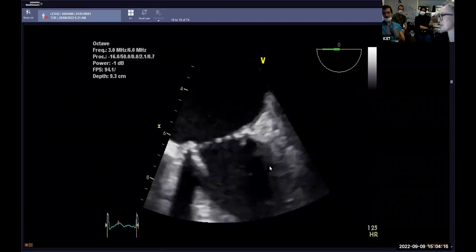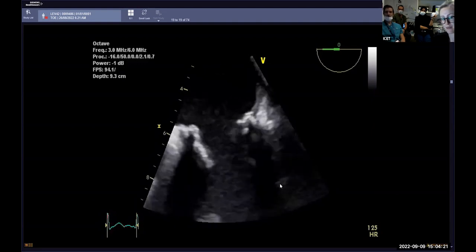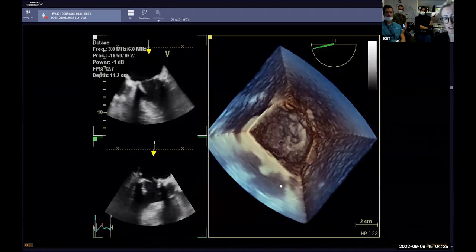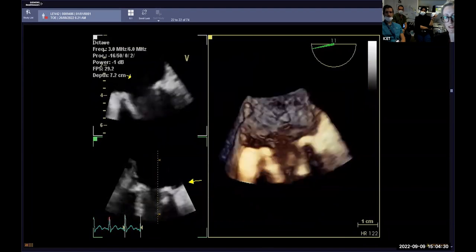No, it's not. You can see it's not obstructed. You've got a mechanical valve. You can see that they're thin structures that appear to be opening okay. And again, all that tells us is that we've got rip roaring regurgitation. Now these are coming up to some of the money shots now.